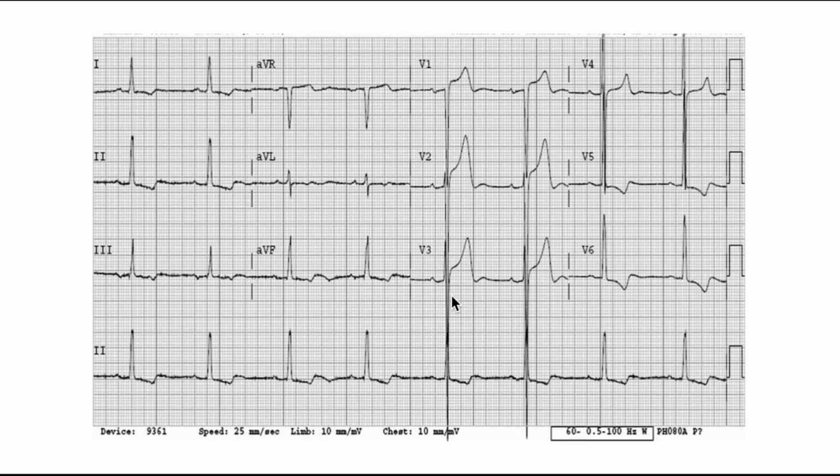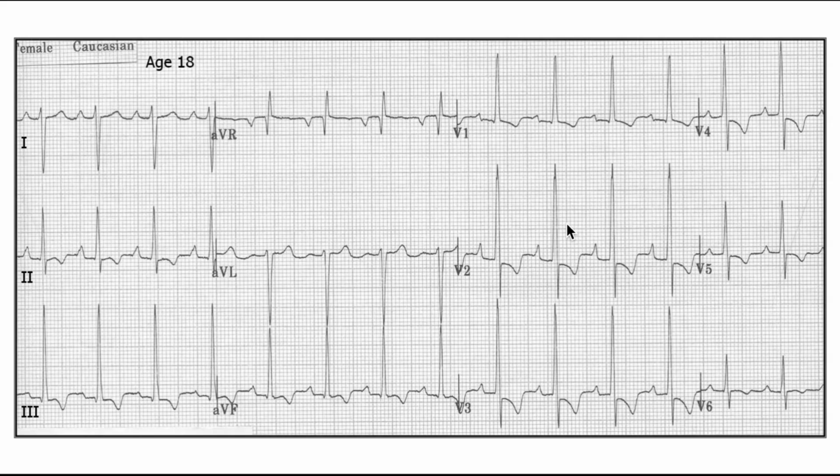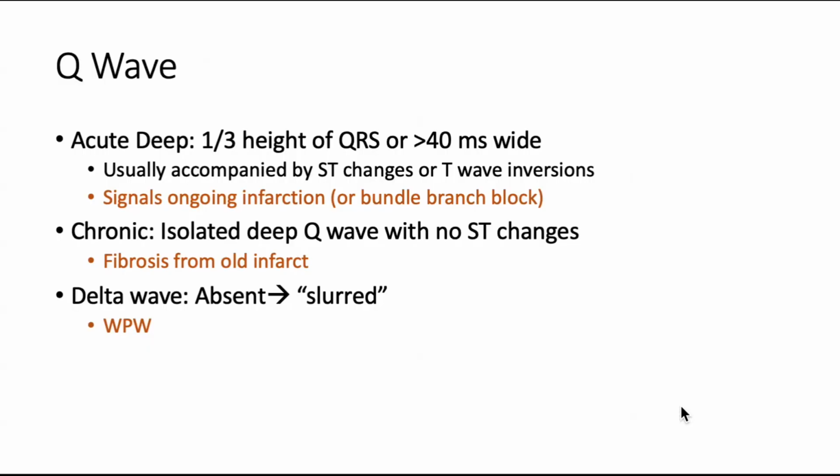I mean, look at that. It's just going off of the charts. You're not going to have a question whether or not that is ventricular hypertrophy. Now pay attention to the S wave in V1, and in V5 you're seeing this really tall R wave. That's left ventricular hypertrophy. Over here, you're not really seeing that huge wave in V5. You're not seeing an S wave in V1. So as you look at V1, you can tell that that's more right ventricular hypertrophy.